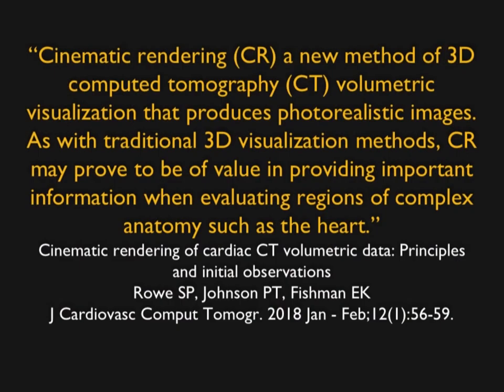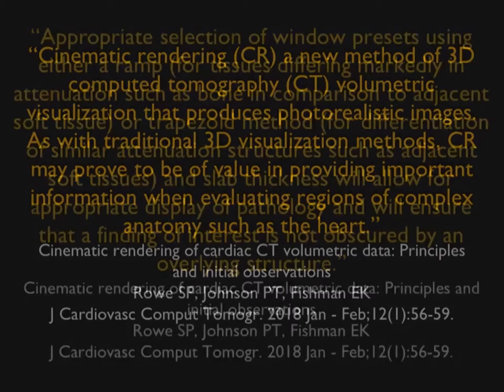Now, in terms of some of the applications, I did put down references to a few articles. There's an article by Steve Rowe talking about cardiac CT volume rendering. Cinematic rendering may prove to be of value in providing important information when evaluating complex anatomy, such as the heart.